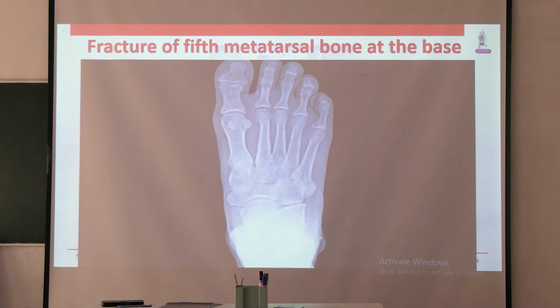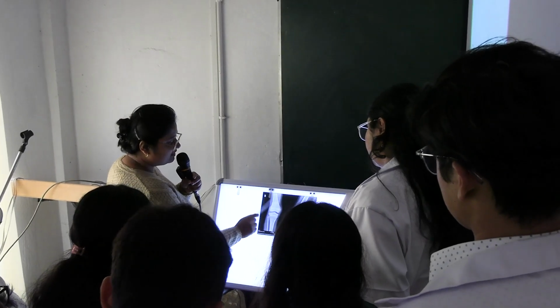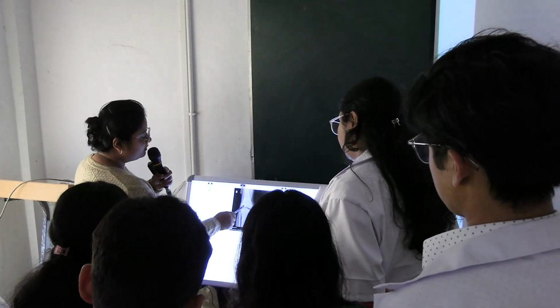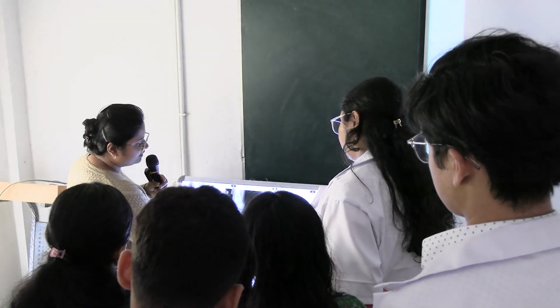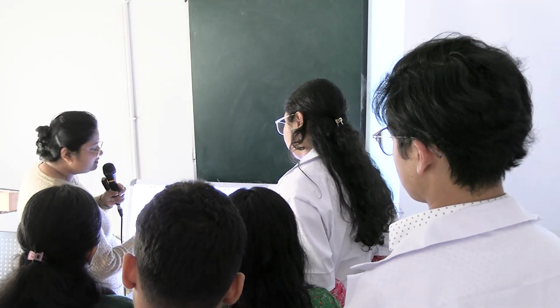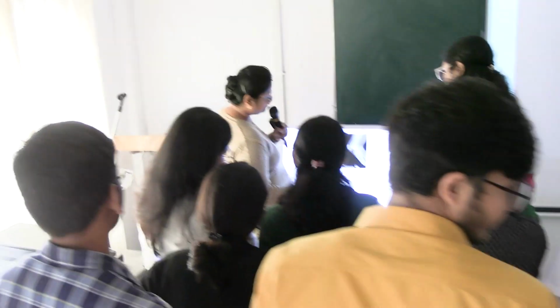You will be able to see from here or you want to come here? Medial, here also lateral, medial condyle of tibia. These are intercondylar area and containing intercondylar eminence. Okay, and this is the joint cavity, containing the synovial fluid, meniscus, like that. Meniscus are cartilage plates, so you will not be able to see them, cartilages.